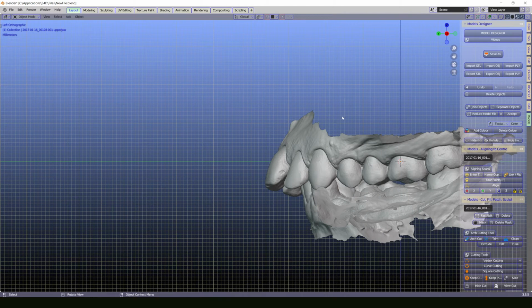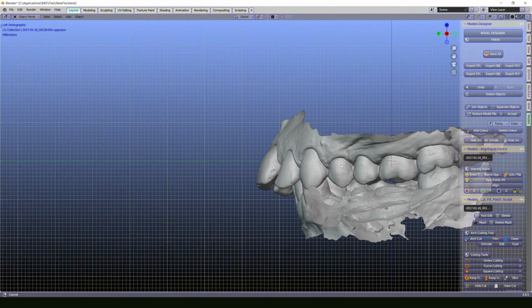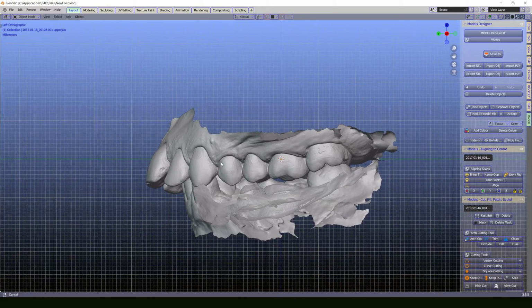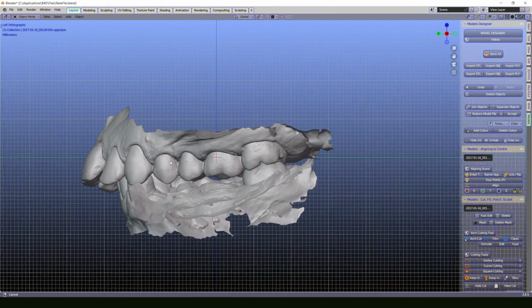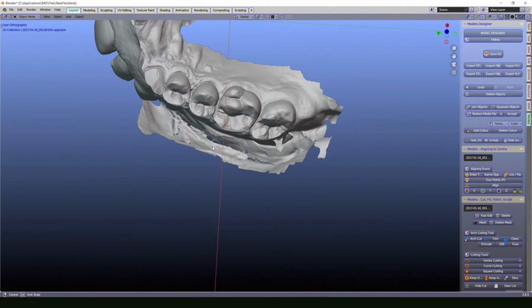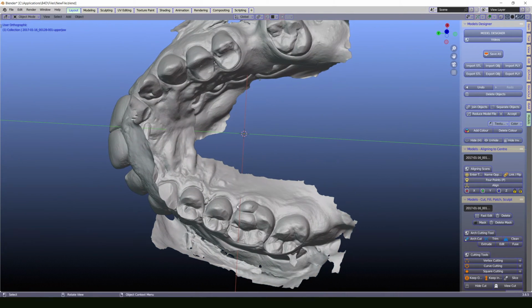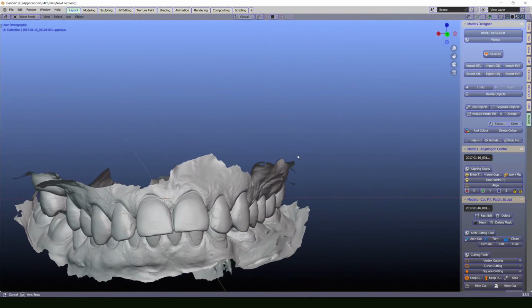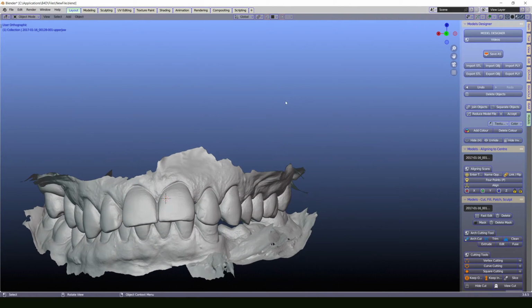As you can see, it would be nice to recenter the models. So hold the shift button and hold with the mouse, drag it holding the wheel, so you can drag the view. I'll recenter it and I will check where our center is, and I like it this way, just a little bit.